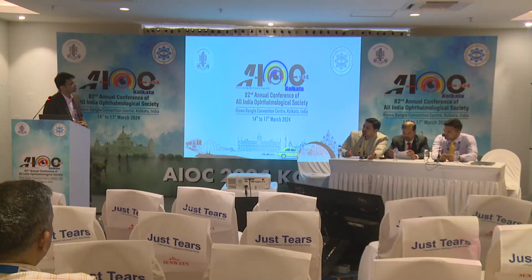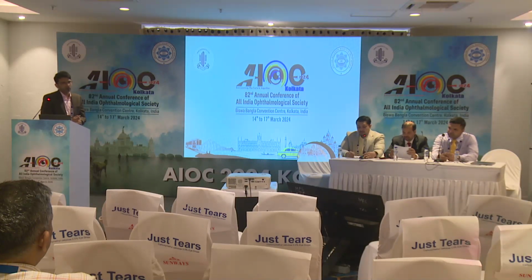Should he invest more to buy a swept source OCT angio, or is it good to start with just the spectral domain OCT angio? So I've shown you the images. Even the Cirrus, that is the Angioplex by Carl Zeiss, also provides beautiful images. I have used it at AIIMS Rishikesh and LHMC also, and I was able to use it in my clinical day-to-day decision making. So that is also good enough. And the Spectralis by Heidelberg, sometimes I feel that provides better slab information rather than the swept source imaging.